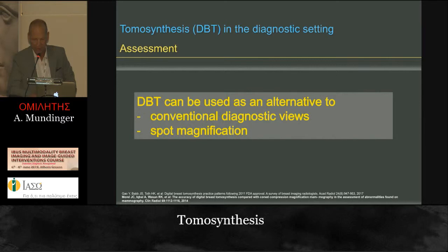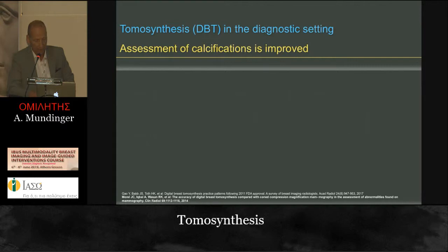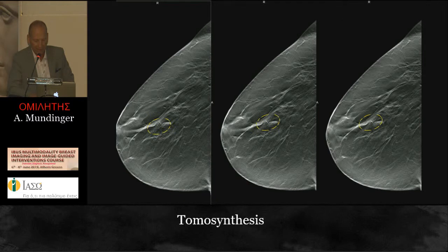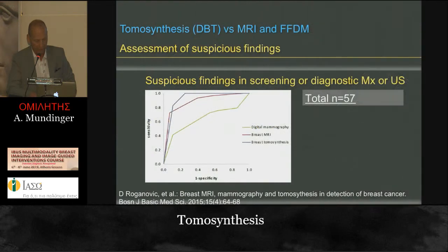So, more about the diagnostic setting. The diagnostic setting is the only setting we can use and will be reimbursed in Germany. It can be used definitely as an alternative to conventional diagnostic views and can just substitute spot magnification. And this is also important in cases of calcifications, because you will see these calcifications. You have sometimes to go a little bit slowly through the single slices, but then you will clearly see these calcifications as good as on spot mag.